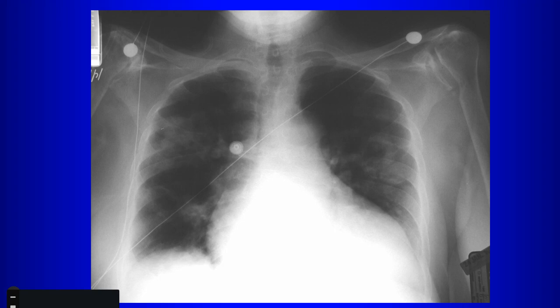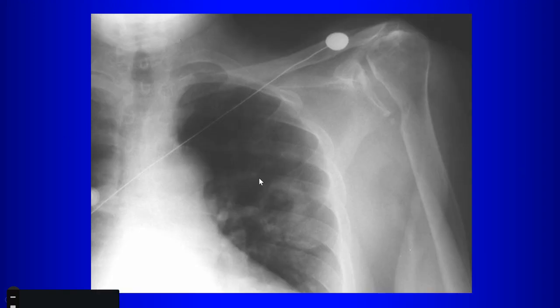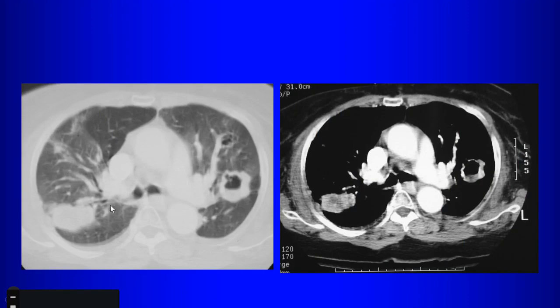Subcutaneous, right? You would ask the physician, does the patient have subcutaneous nodules, necrobiotic nodules? Those patients would have an increased incidence of rheumatoid nodules. Remember, this is rare. Even in patients with rheumatoid arthritis, to develop rheumatoid nodules in the lungs is pretty rare. But the question you want to ask is, do they have skin lesions? Do they have necrobiotic nodules in the skin? So there are changes of rheumatoid in the shoulder. These, of course, are cavitary lesions, and anywhere else this would probably be something else in real life.